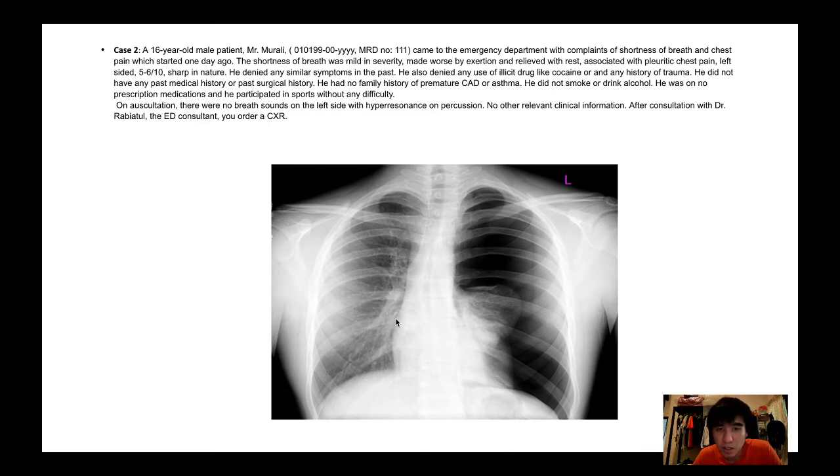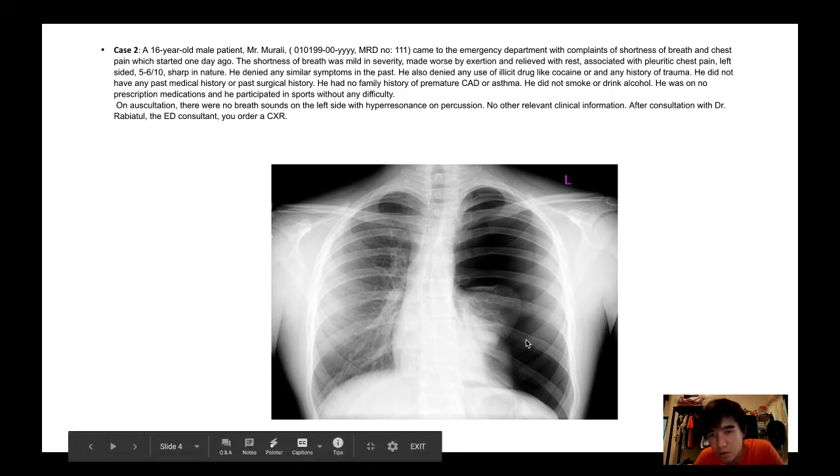B, it's breathing, the lungs. Over here looks slightly darker than the rest of the lung. Over here you can see lots of lung parenchyma. Looks quite hazy, but if you compare here, it's totally nothing here. There's no lung tissue here.